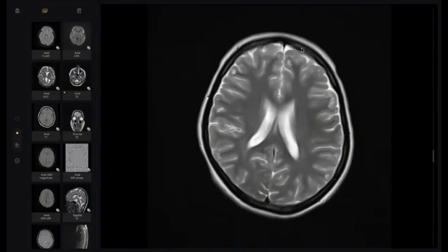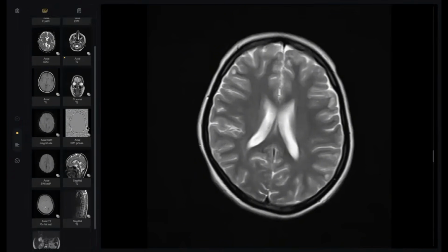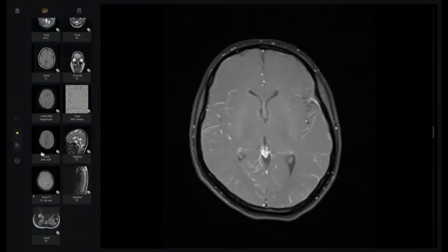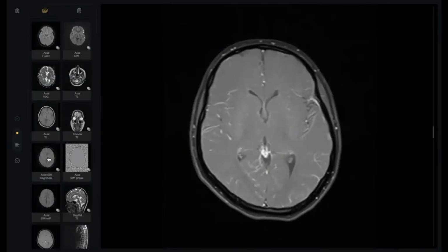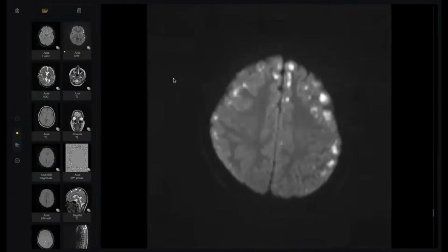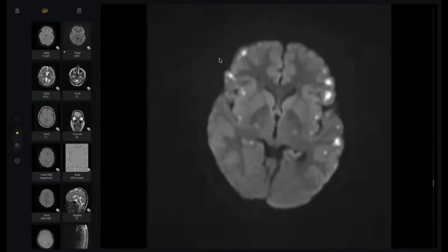What's your final diagnosis? Okay, I would be going with infarct. However, I would like to search for the cause. I would like to go for the MRA and MR. If I told you the MRA is normal, okay? What do you think? Maybe normal.